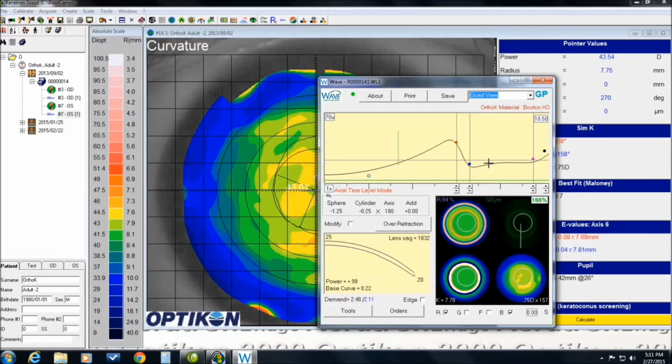Now, something I noticed some years back is that when doing ortho-K, particularly for a kind of a dry eye, it's helpful to make the lens so that where the reverse curve comes down, it's at about the same level of where the apical clearance is. So I want to bring this down somewhat. I'll go ahead and do that and try to get them closer into alignment.